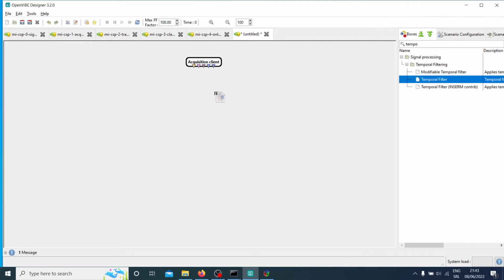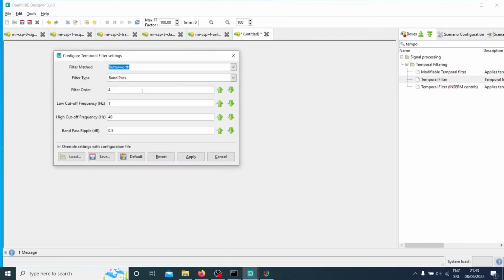If we want to filter, for example, if we want to use beta or alpha waves and so on. Beta will be around, sometimes it's 15 to 30. Sorry, I'm a little bit sick actually, so it's difficult to focus. So it's from 15 to 30 for beta, or from like 8 to 12, you would have your alpha waves. And this is the band pass filter, okay? Band pass, so it's passing these frequencies between 8 and 12.